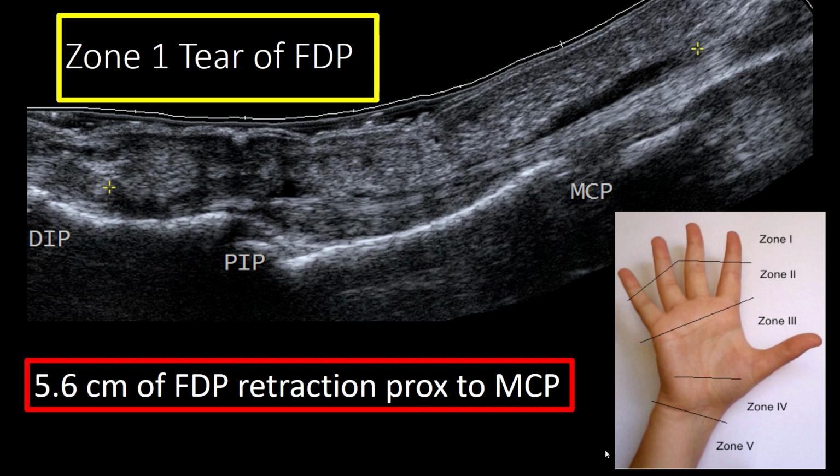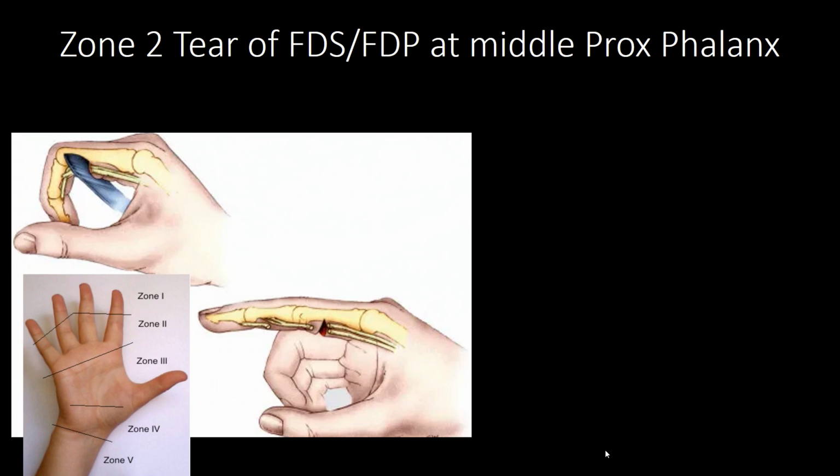Our hand surgeons really place a lot of value on these ultrasound exams. Here with this extended field of view, this really helps surgical planning. You can see the torn tendon margins. We can tell them exactly what zone it involves. We can tell them how much retraction there is, and they know how far to make the incision, to dig around and pull it back, so they're not doing it blindly initially. So this is great for preoperative planning.